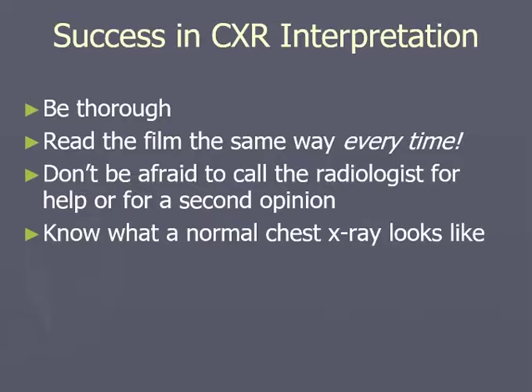Before you even follow along with the radiologist report, you can look at the raw film on your computer, and then go ahead and read the radiology report and see what they had to say about it, and see if your interpretations match.